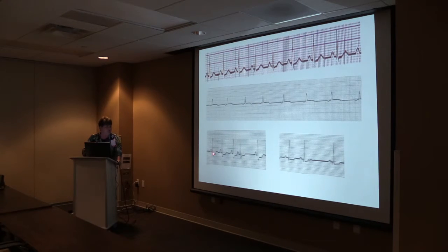Let's look down here. P, QRS, T, P, QRS, T, P, QRS. What's this? Here, look here. This beat right here comes early. What is that? So let's find all the P's. If this is a P and this is a P, let's get the rhythm going. What happened? This came early. So you have to ask yourself, is that a P wave or is it a T wave? How do you know? You have to go back to the norm.